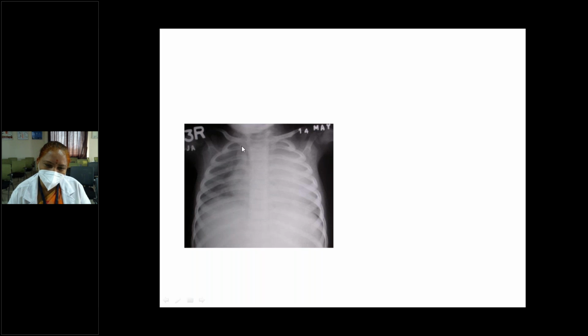For cardiomegaly, we have to take the cardiac diameter and the inner thoracic diameter. More than 50% indicates cardiomegaly; in case of AP view, more than 55% indicates cardiomegaly. We take the maximum diameter of the convexity on the right and left sides and add them, and this will be the cardiac diameter.